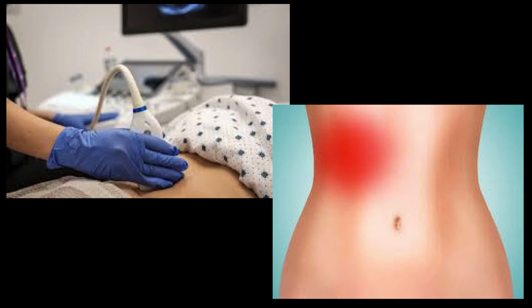A right upper quadrant scan is a common scan for a sonographer. The scan includes images of the liver, gallbladder, bile ducts, and right kidney. I enjoyed learning this scan. This presentation is images from a RUQ scan I did a while ago. I will be going through the scan as well as critiquing my own images on things I would do differently.